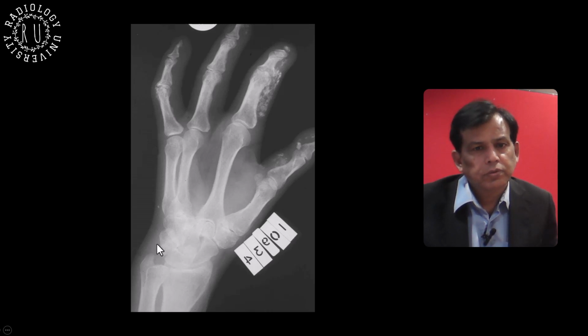However, the carpal arcs appear normal with some reduction in joint space. Combining the pulmonary features of chest pain and breathlessness with the cutaneous and musculoskeletal manifestations, I would like to put scleroderma as my top diagnosis for this patient.